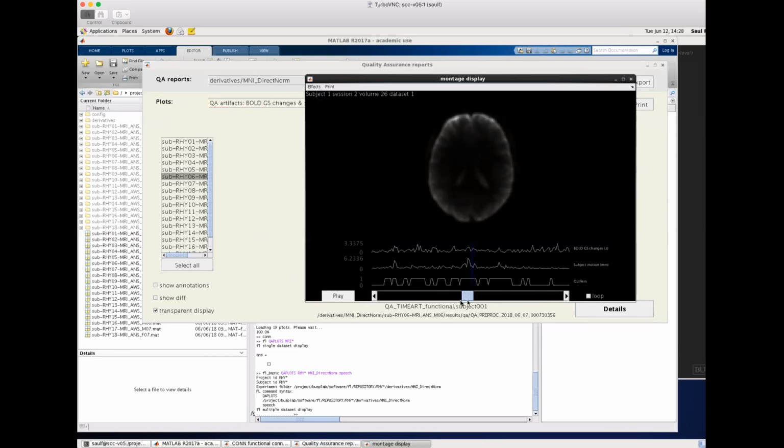Is the amount of residual motion here, like, there are some scans that are clearly... Yeah, that's fine. Pretty much the entire second session is out, except a few valid points that are just interspersed there.